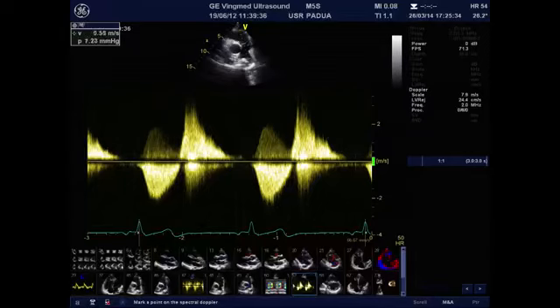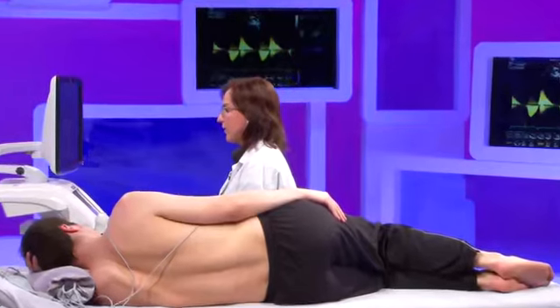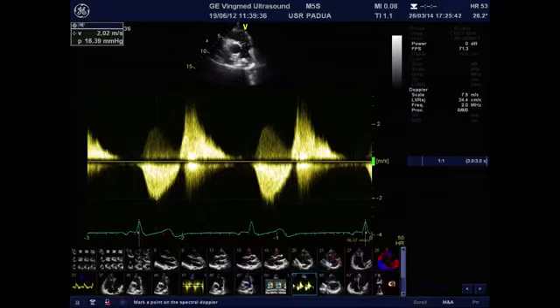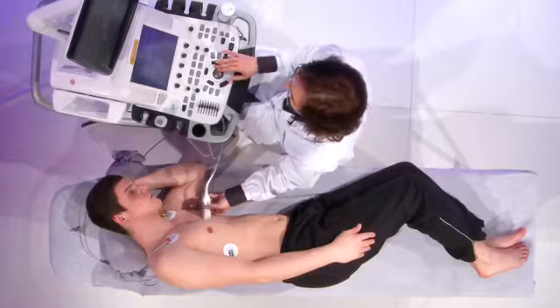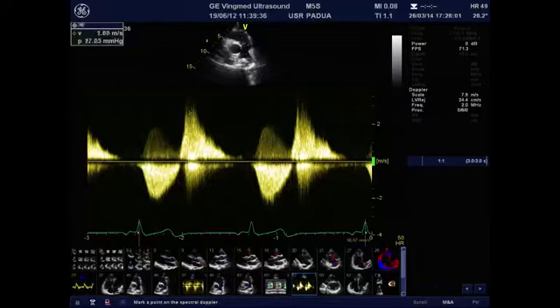Here you have the antegrade flow, which measures, in this case, 2 meters per second, which is reflective of a high antegrade volume that is the consequence of this significant pulmonary regurgitation, and it's not indicative of fixed stenosis, but is a relative stenosis. And in diastole, you will see the envelope, the signal, which is intense and has a steep deceleration in diastole, which reaches 0 before the end of diastole.